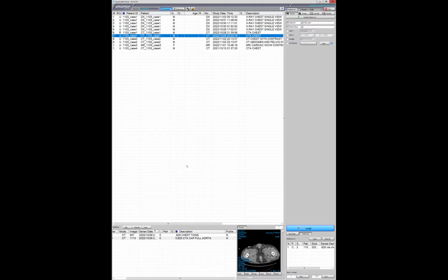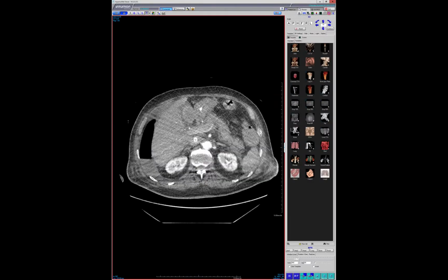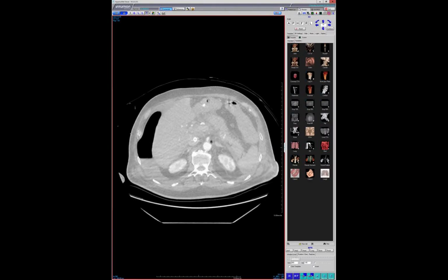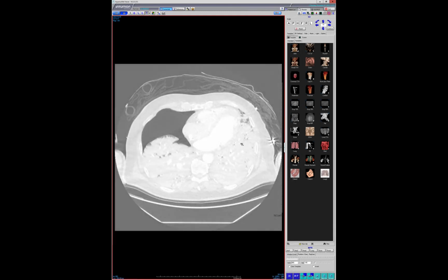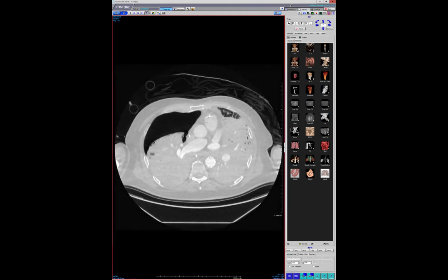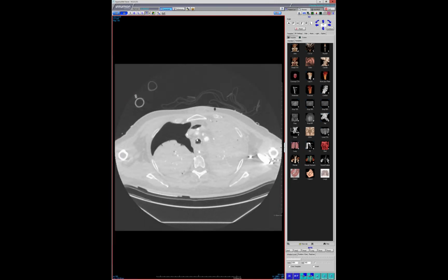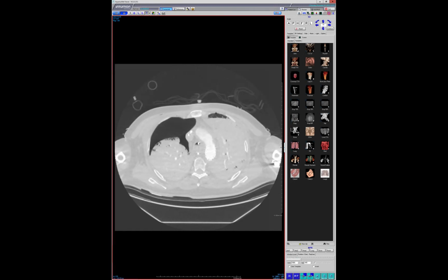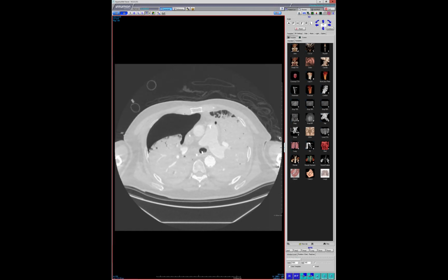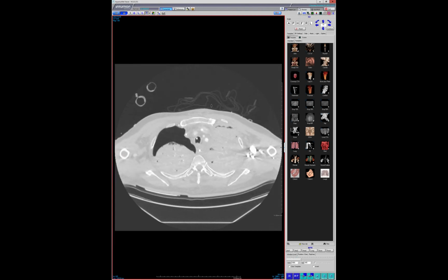Anyways, so then he codes. They put in a covered stent and he codes, and this is his lungs literally the next day, after they put the stent in. He's got a pneumothorax. He's just got dramatic secretions in the trachea. They actually have a bronchial blocker because some of this is hemorrhage.